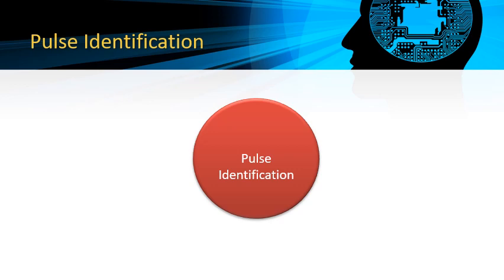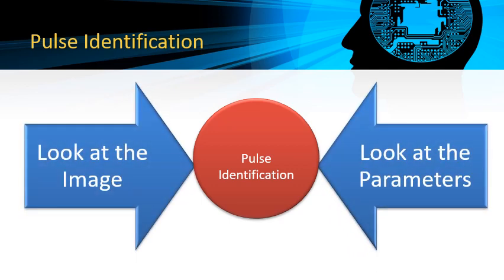So as we have described the first pathway for pulse identification, through the identification of the parameters and knowing what they mean, we have another pathway, which is a more clinical pathway, and it's what we usually use in clinical practice. This pathway is used in the absence of the identification of the parameters, through looking at the image signal characteristics, as we will describe in the next slides.